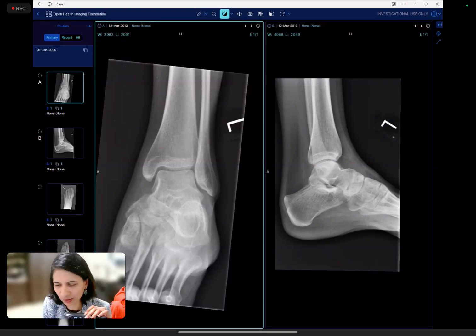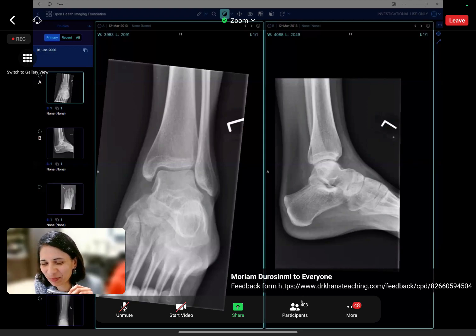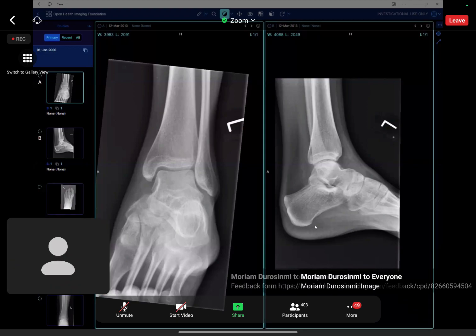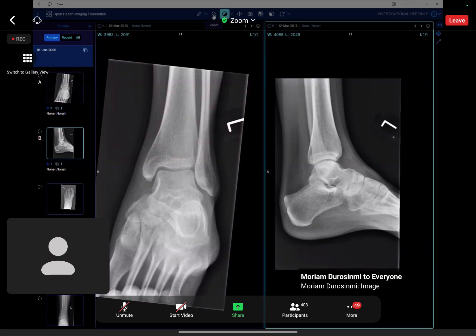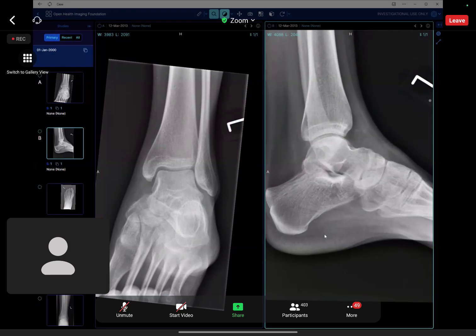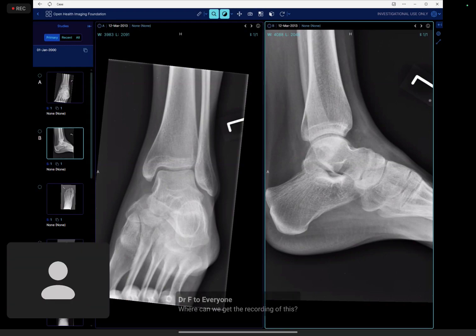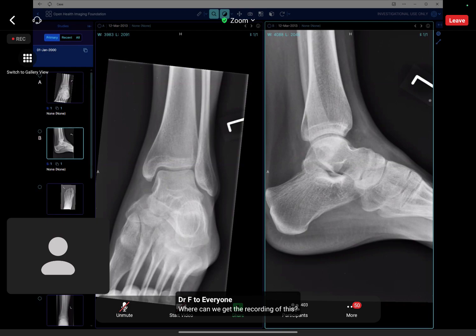Okay, so that's your time, but please continue. Now you can relax, and please describe what you see. Okay. So you look for calcaneal fractures, yes? Yes. I think I can see a lucent line actually on the calcaneum, but it's more towards the lower aspect of the left calcaneum on the lateral. Just trying to also see if there's anything at the base of the fifth. I can't see any there either.